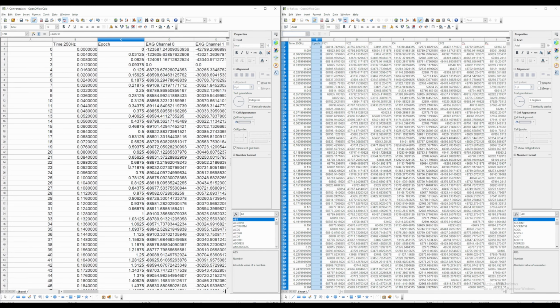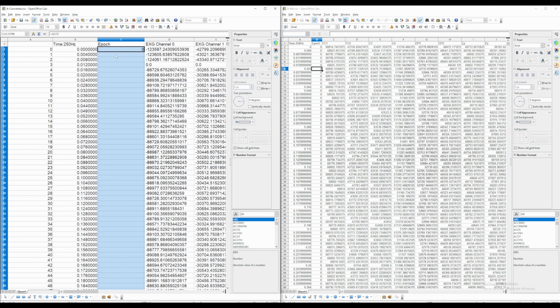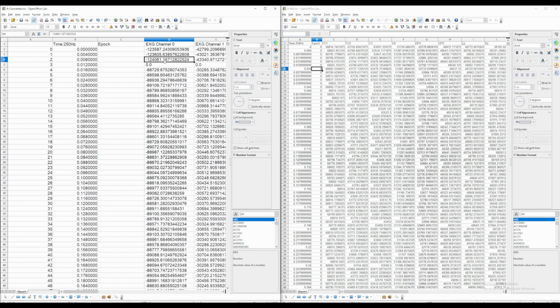So if I could keep just the integer part and get rid of the fraction part, I will basically have what I need for my chunk structure. So we do that using the quotient function, both in math and here. Quotient is basically the other side of modulo. So modulo will give you the right side of the decimal, the fraction, and quotient will give you the whole part.